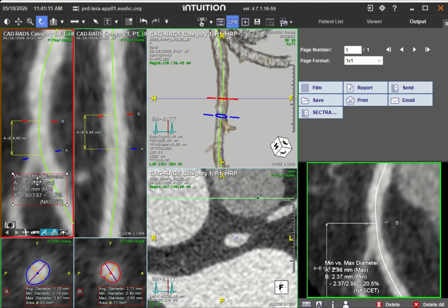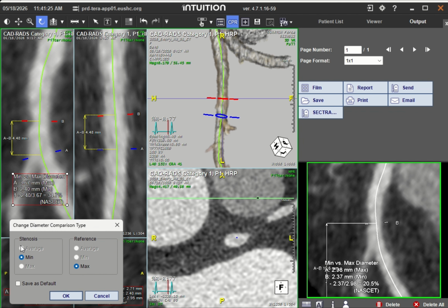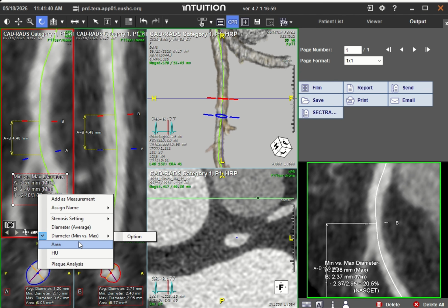Now, we don't use that really very much in CT. We're doing area-based average more often. So here under options, we're going to, it's not allowing me to fix it. Simple. Perhaps this will now allow us to do it.